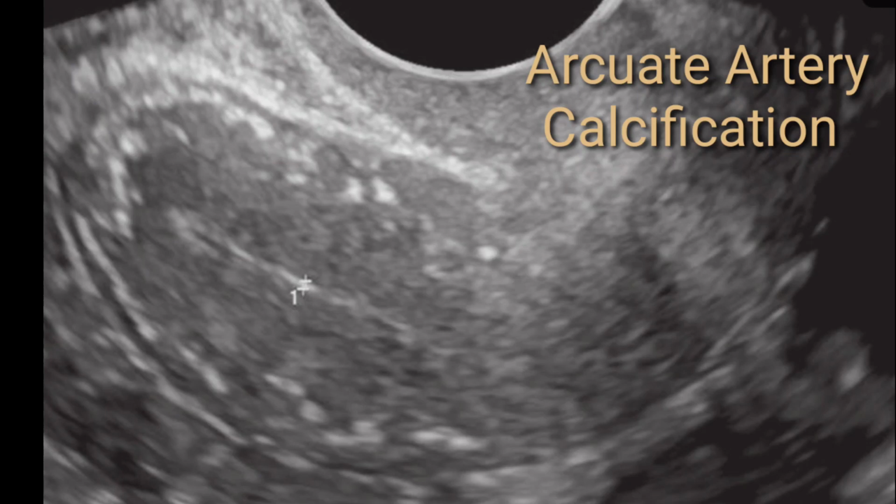In post-menopausal patients, these calcifications are normal. This is not really because of a pathological process, but because of senile degenerative changes, this calcification may take place. So you have to mention in the report that the patient's uterus is normal in size, myometrium shows some postmenopausal changes with multiple dense tiny calcific foci settled in the peripheral myometrium.